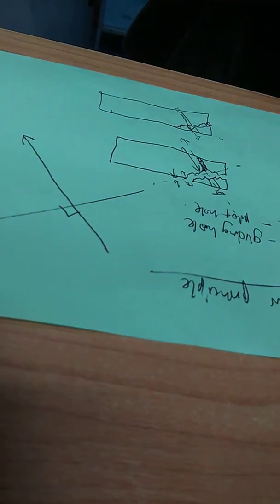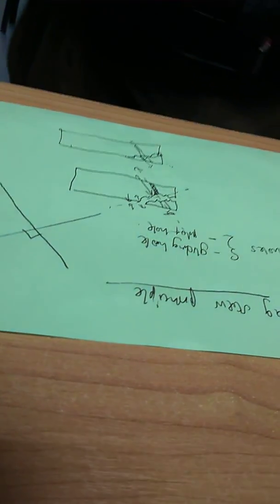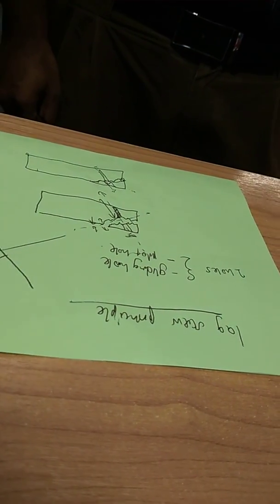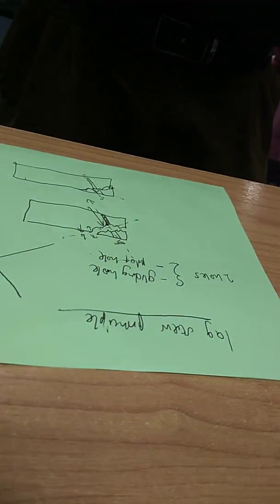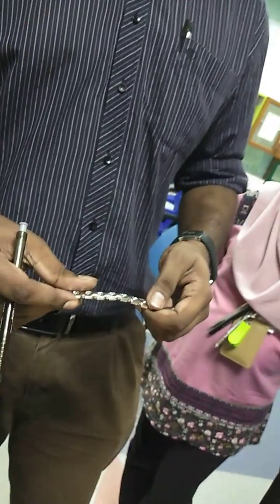There's another type of plate, which is a neutralizing plate, which I forgot to mention also. This plate. What plate is this? What is the benefit of this plate? You can see in between the holes there are areas here which you can shape and bend with a plate bender, according to the contour of the bone.